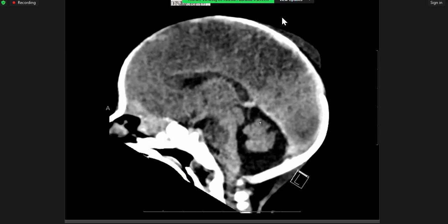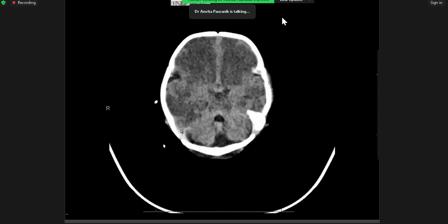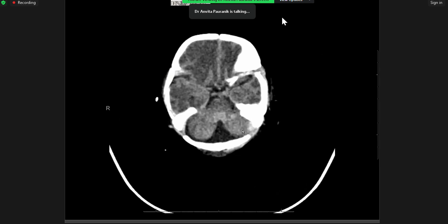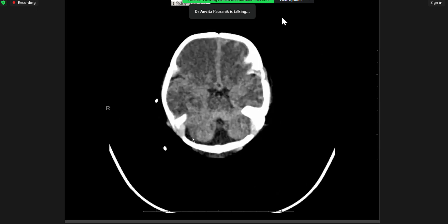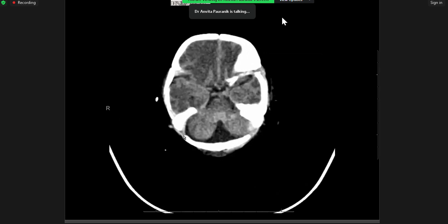Yeah, the sagittal, perfect. So the vermis extends from the tectal plate roughly to the lower medulla, and this is a newborn, right? In newborns sometimes you can get a little bit of prominent retrocerebellar space. So that's totally fine. We are not using CT for anatomical detail, and it's not a good idea to overcall stuff here. I will not mention cisterna magna in the impression because it's not relevant, and I would just simply use the term prominent retrocerebellar CSF space.